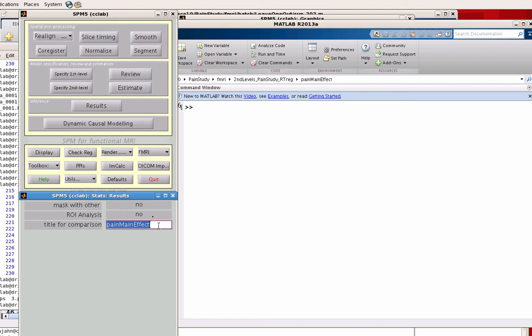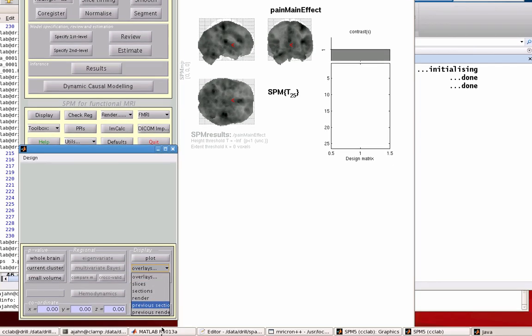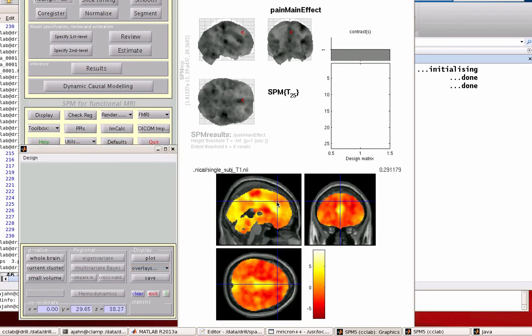Just to show you what I'm dealing with right now. First thing, when I'm loading this up, I'm setting the p-value to 1. I'm not clustering at all, just so I get every single voxel activated so I can get each coordinate. Now, you may have seen me do this in a couple of other tutorials, but what I'm dealing with is four regressors, and what I noticed just looking at this is that three of the regressors seem to be very active in this more dorsal aspect of the medial prefrontal cortex, and the last regressor was more active in this region down here, the more ventral anterior cingulate. And the patterns were basically reversed. If you go up here, then that single regressor isn't very active, but the other three are. Go down here, the other regressor is active, but the other three are not.